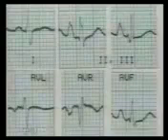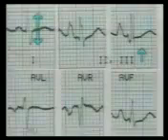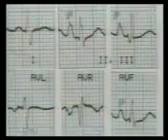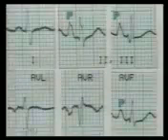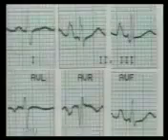Now come to limb leads. There is no gross deviation of axis, but there is a negative wave in 1 and AVL and a positive wave in lead 3, suggesting tendency to right axis deviation. Now note the P wave in lead 2. A very typical tall and peaked P pulmonale is seen in leads 2, 3 and AVF, diagnostic of right atrial hypertrophy. So this ECG shows right ventricular hypertrophy with right atrial hypertrophy and right axis deviation.